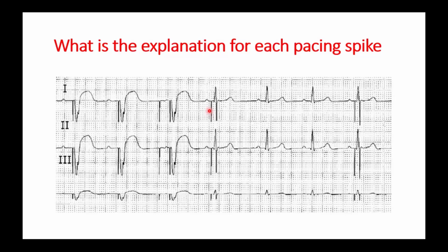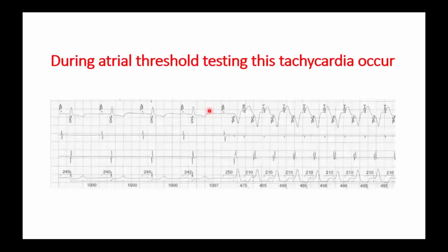Okay. Well, next example. This was noticed during atrial threshold testing. This tachycardia occurred.